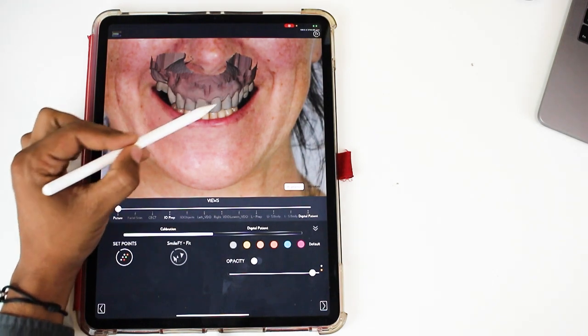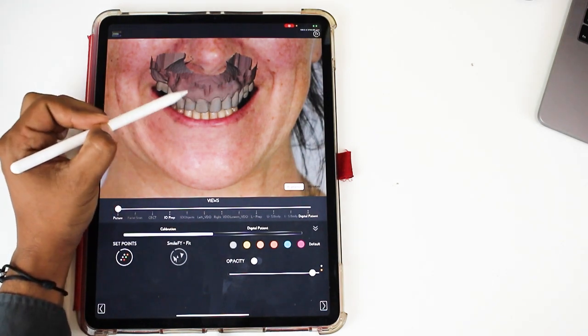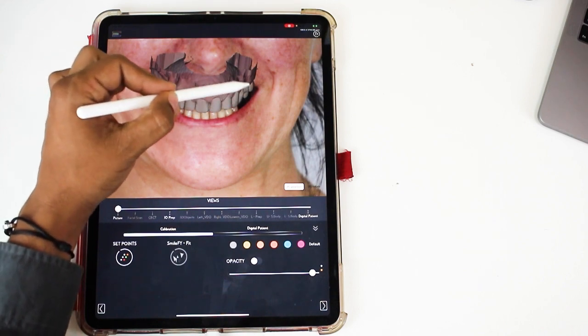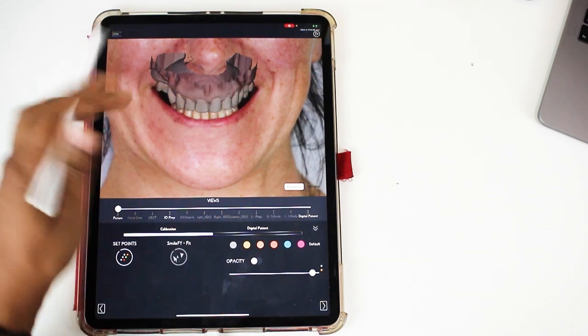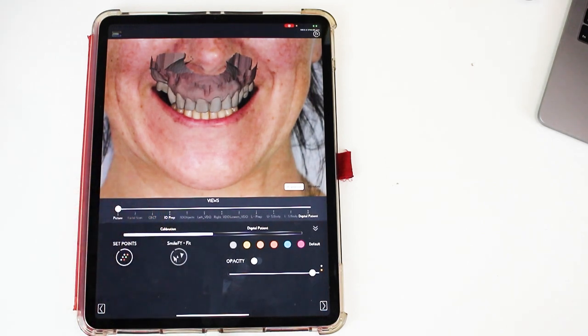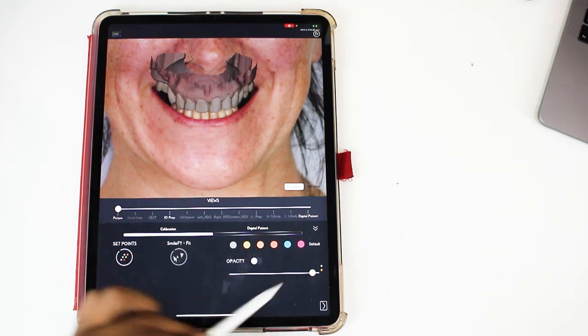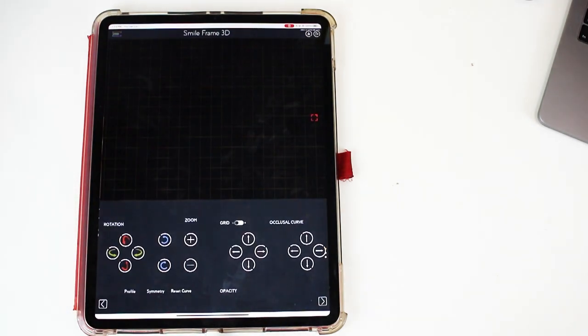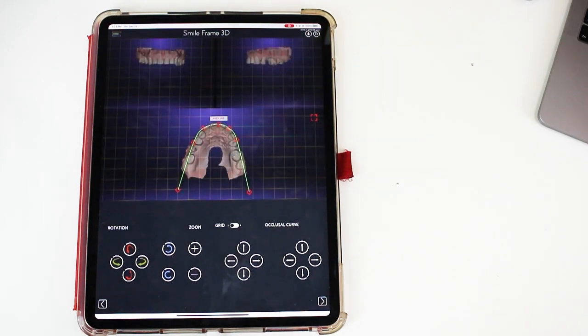So as you design, as you deliver your smile zenith, as you create the smile curvature, you gather all this information and deliver a more natural looking 3D wax-up, which will help not only you, but also the patient to understand that her smile must be as unique as her face.